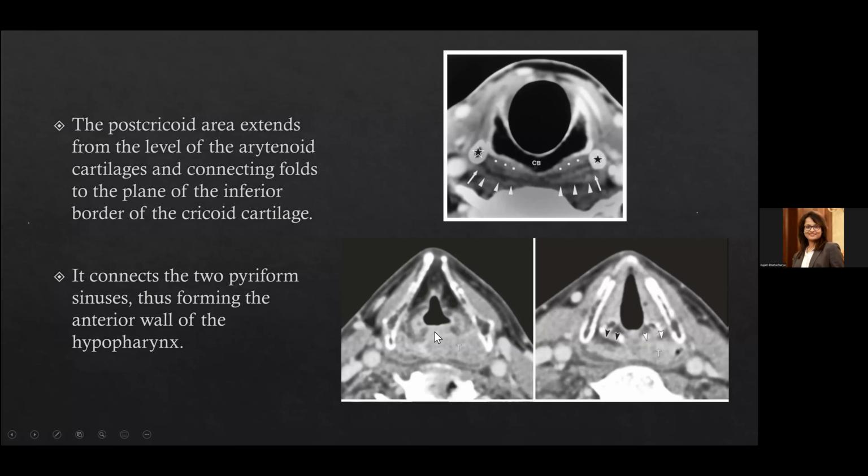So this is the post-cricoid carcinoma, which is possibly extending into the supraglottis also. What we are basically seeing here is this post-cricoid carcinoma. Nicely, the tumor, this bulge, is very nicely identified.